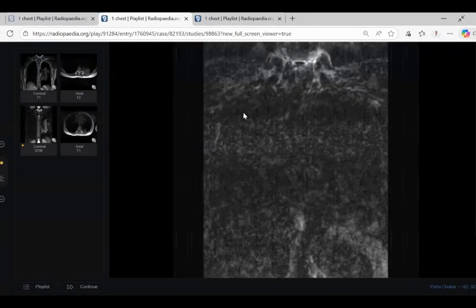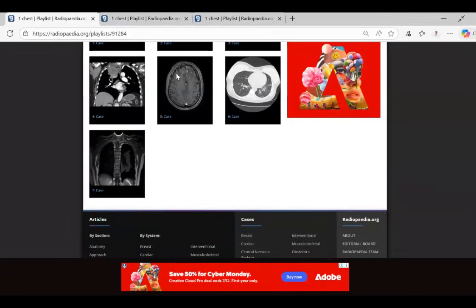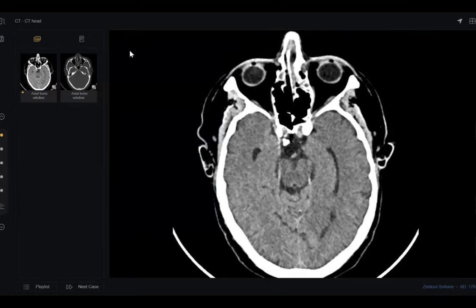Sir, I have one question, please. What is the soft tissue thickening that is involving the bone of the skull as well in the same case, previous case, sir? Yes, sir. So here, a soft tissue swelling is also seen extending into the soft tissue, and it was enhancing post contrast. See, all of these are sarcoidosis.